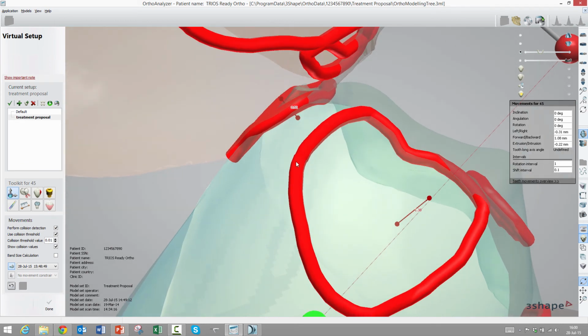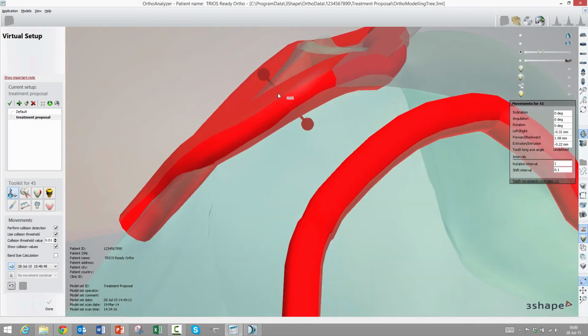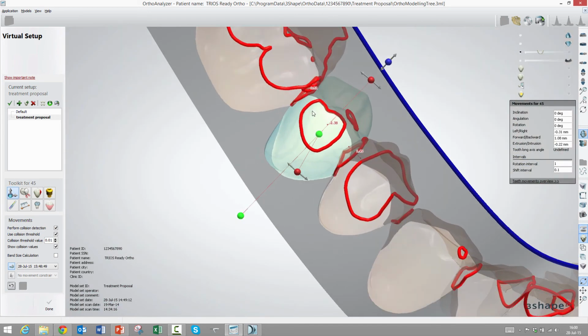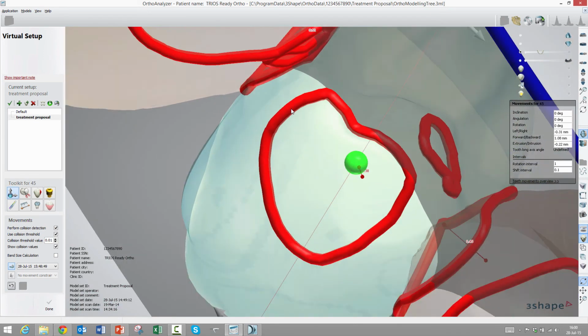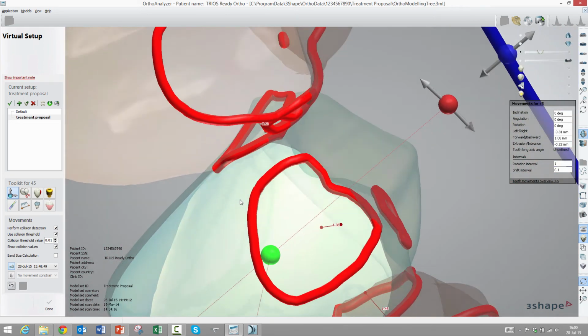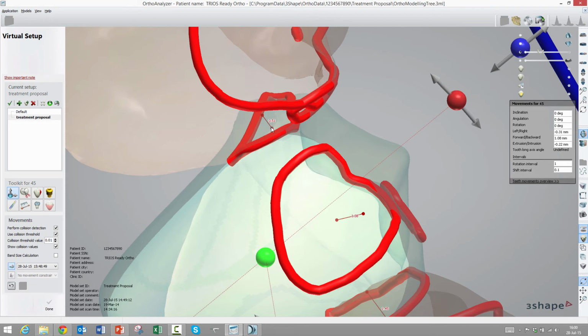A very nice feature is that the direction of this collision, or the way it's measured, is shown on this tool. If you look carefully, you can see this little segment showing in which direction the measures were taken.